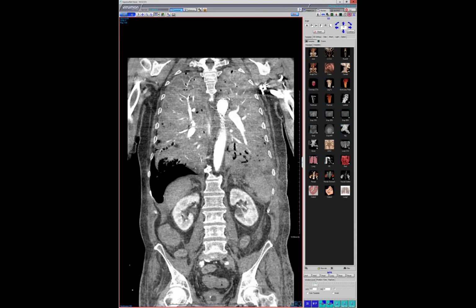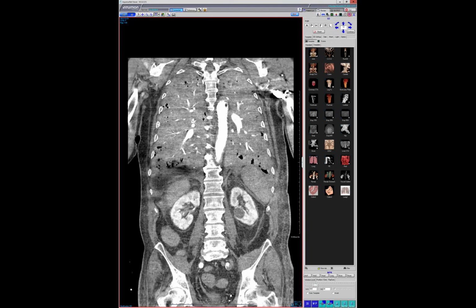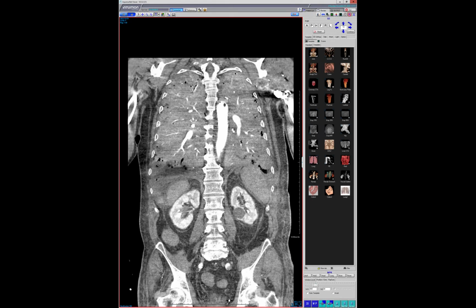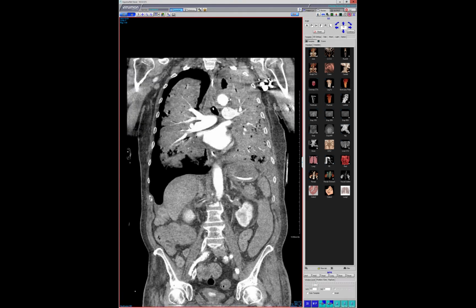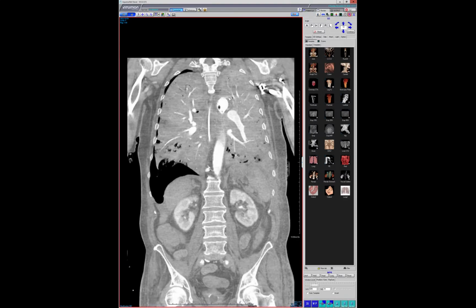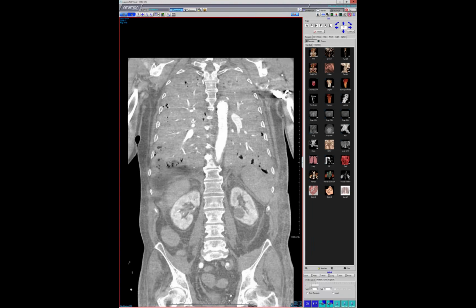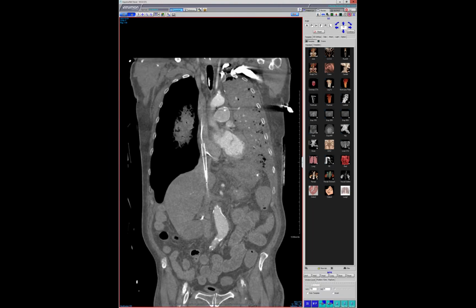Yeah, because he doesn't have a lot of volume loss here. It's not like the lungs are completely collapsed, they're filled with something. To me, there's not just collapse. I mean, I agree, some of it is definitely going to be atelectatic lung because he's on ECMO. I don't know the answer. Yeah, so okay, that's the ECMO cannula in place then. So this is the right CT at the time of ECMO.